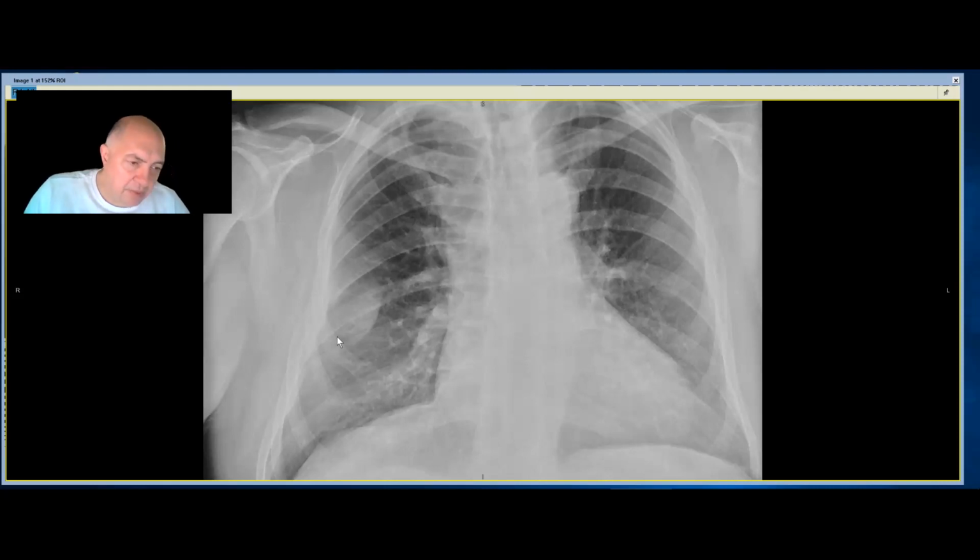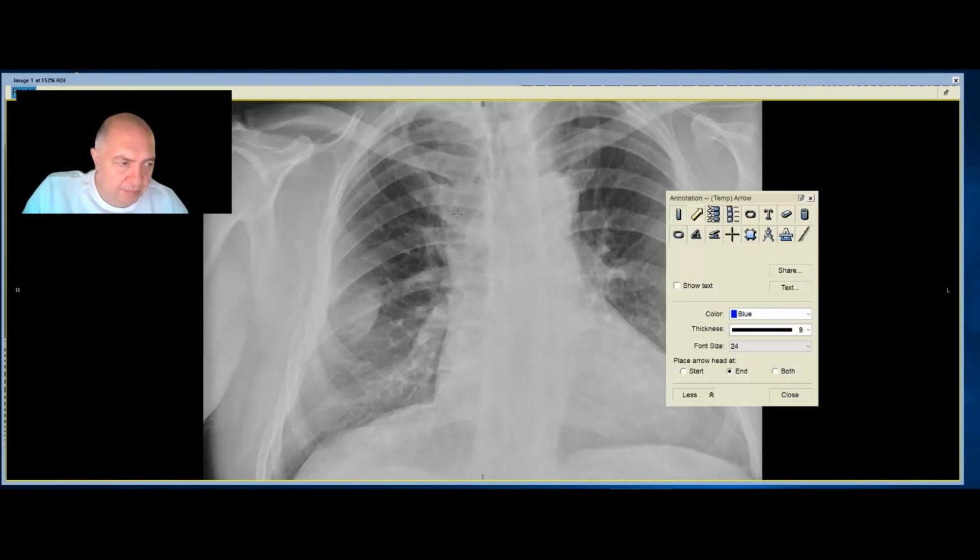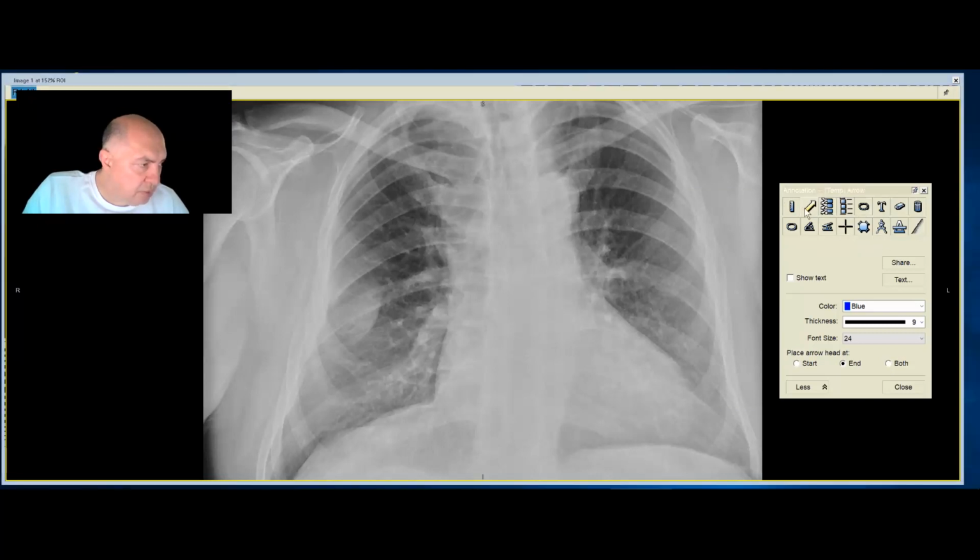It's a nodule, and it's overlying the rib, but the rib does not seem to be eroded, and it's possibly pleural based because it's concave in margin. Let's draw a picture there. So it's a drawing arrow there. That's the nodule there. So it's quite well defined.